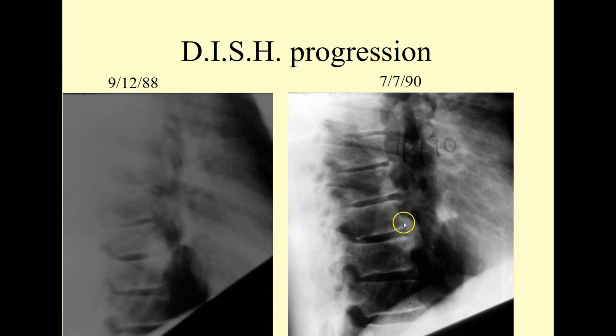Two years later, we see what's really going on is very thick, flowing, exuberant ossification, sometimes referred to as an undulating pattern of ALL thickening. That clearly is a good start on DISH. I say good start because the principal researcher, Forestier, did a great job identifying the characteristics and the distribution, but claimed to require 4 contiguous segments.